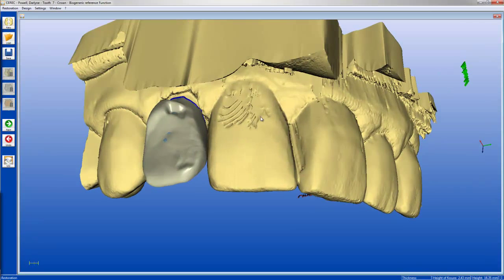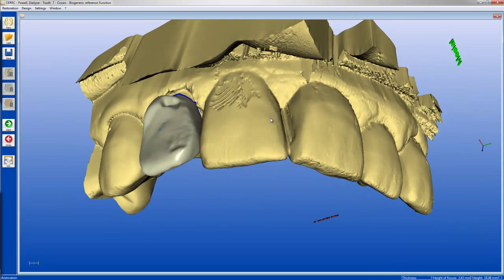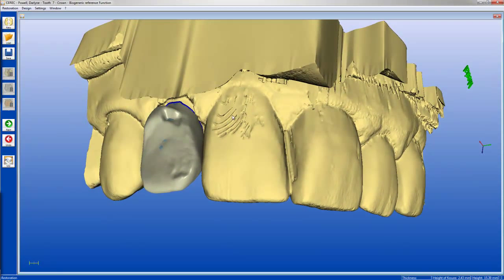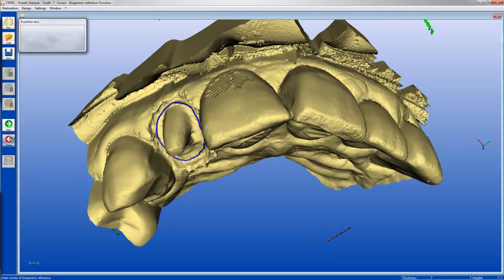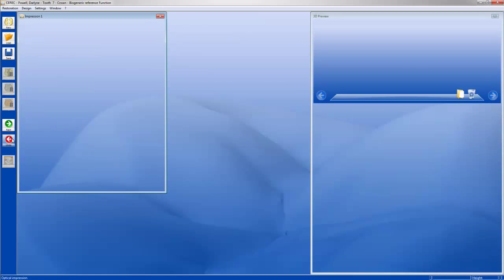Now before we do that, I'm taking a look at the model. We've got some model distortion here, and this is typically the sign of just some extra images or some sort of powder on the lens or some other issue. If you see this and it looks almost manufactured, hard to describe it, that's a graphics card issue. When you see lines like this in just one part of the area, that's typically the sign that there's some images that are causing some corruption of the model. So I'm going to go all the way back to the beginning here, and let's see if we can't troubleshoot and see what's going on.